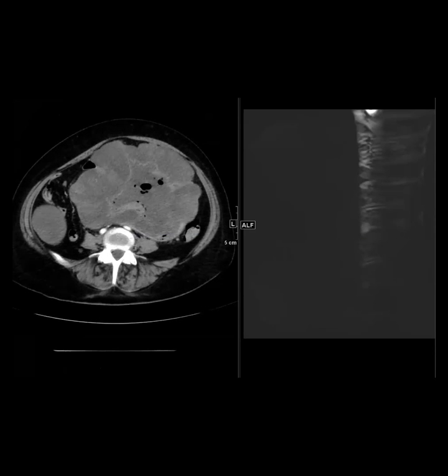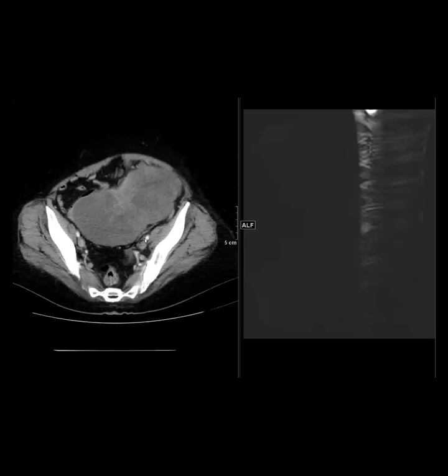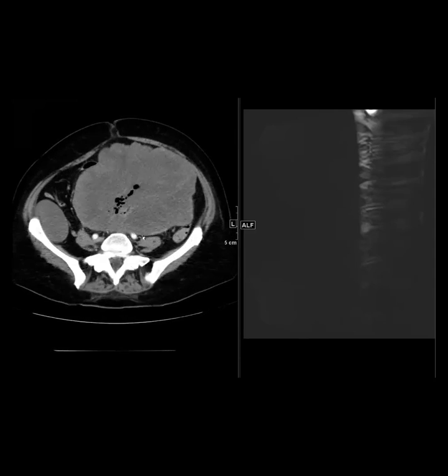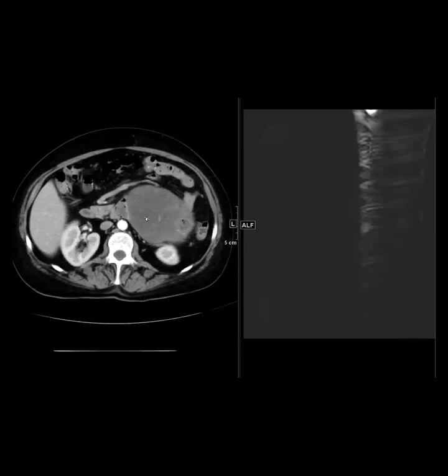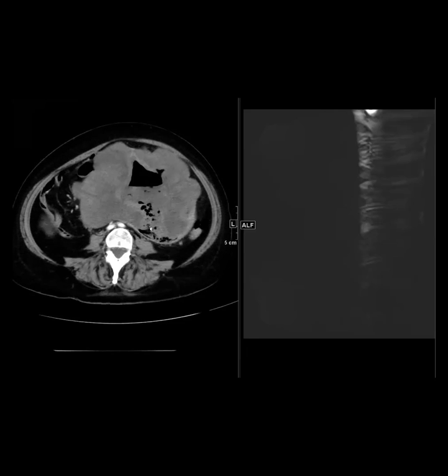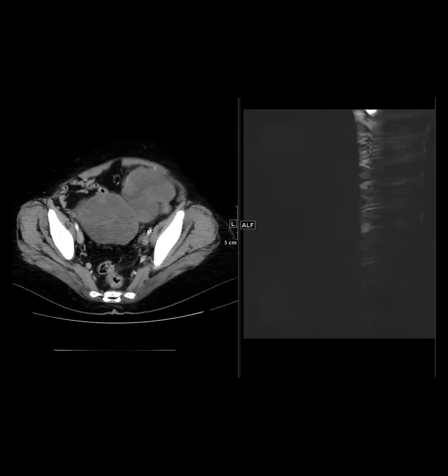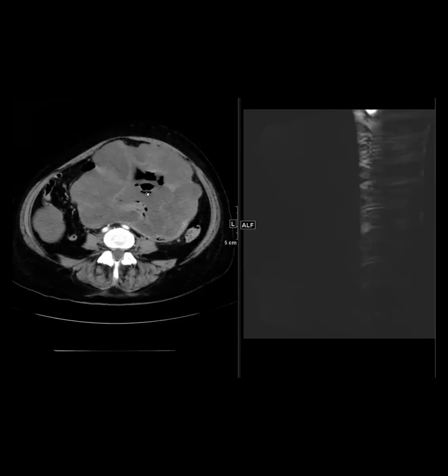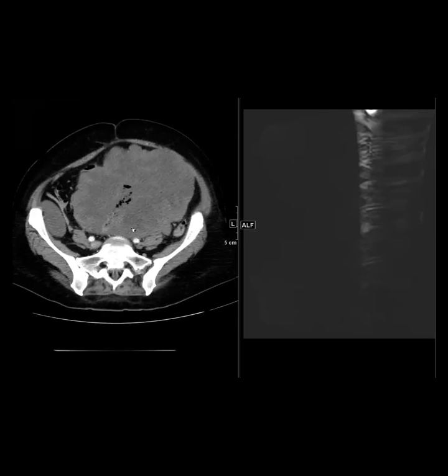Any thoughts? I mean, a malignant GIST, a melanoma met. Yeah, exactly. So I was favoring a GIST, maybe of the proximal small bowel here with communication with the bowel loop. Somebody brought up lymphoma, or could this be aneurysmal dilatation of the loop? That would be pretty aneurysmal. But anyway, the clue was actually in there.